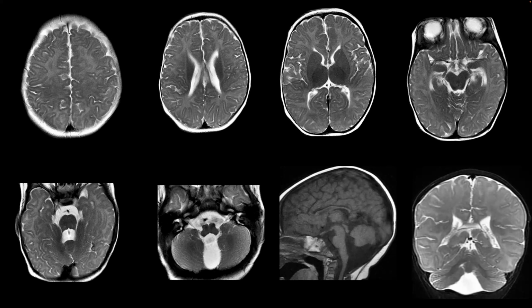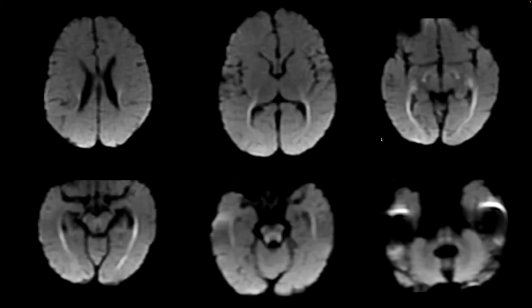So I would say on these images, there is periventricular volume loss, hypoplastic or thinned out corpus callosum, hypoplastic brainstem, pons and cerebellum. No structural abnormalities. For a 4-month-old child, I think the myelination is all right. The posterior limbs are myelinated. The anterior limbs are almost starting to myelinate. So these were the main findings, at least on these sequences. And then the diffusion weighted sequences demonstrated these symmetrical areas of restricted diffusion, predominantly along the corticospinal tracts going up to the pyramidal tracts.